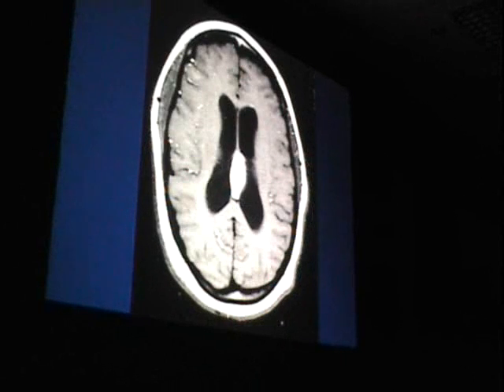And the patient had an MR which showed this hyperintense focus within the midline. And all these areas which are hypoattenuating on CT are all bright on T1 weighted image. So this clearly limits the differential substantially, with things that are bright on T1 essentially being fat, melanin, contrast, and blood. Clearly it's not blood based on the CT, and if it's bright on T1 and dark on non-contrast CT, it is fat. So what we have is a midline dermoid or possibly lipoma, which has ruptured.